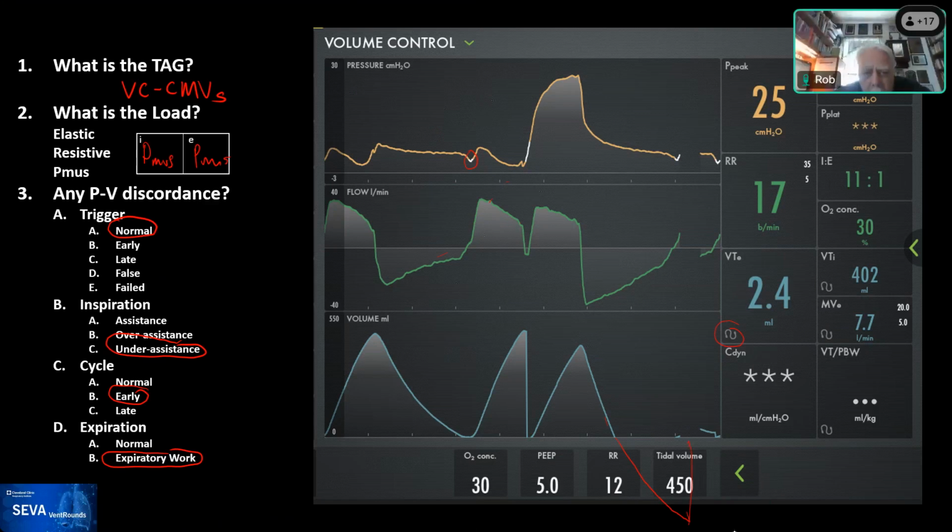Yeah, the important thing here is that if you just looked at what the screen's telling you, it looks like the patient got 3 breaths at around 400 mLs. But the fact that he didn't exhale on the second breath and got another breath in means he's got probably around 800 mLs. And you can verify that by looking at the flow waveform because, again, the area between the flow curve and the horizontal axis is volume. So that big exhalation has an area of about those two inhalations added together. In fact, it is that. That's what it has to be. So that's how you can verify that that was a huge breath, a double breath.